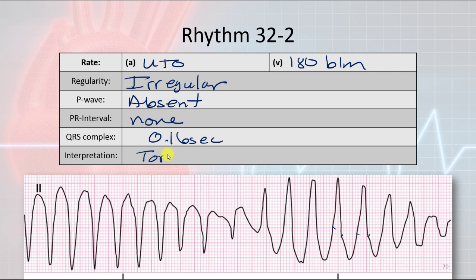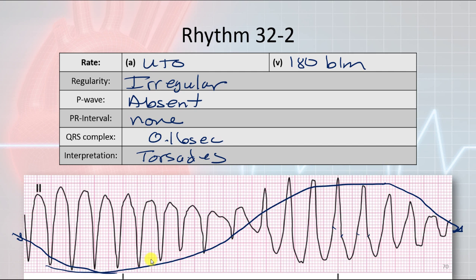Interpretation, this is another. This one's really cool because you can see the points down here and you see how they kind of switch, and now the points are up here and the curves are down here and the curves are over here and they're up there. So what's going to happen is it's going to start doing this again, and as it heads down in this direction, it's going to come from here and it's just going to start doing this again, and it's going to keep flipping like that.